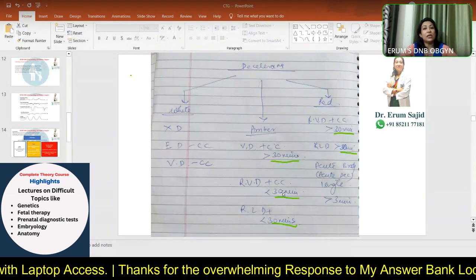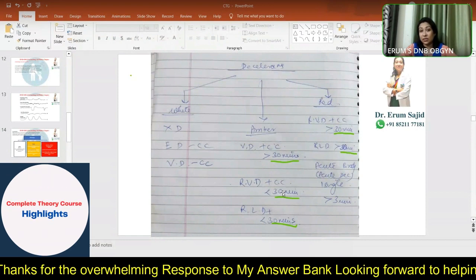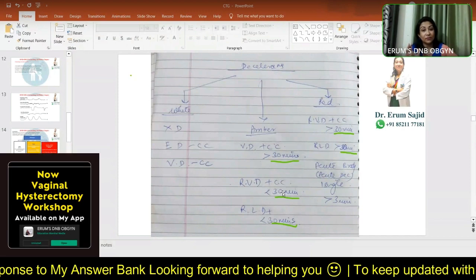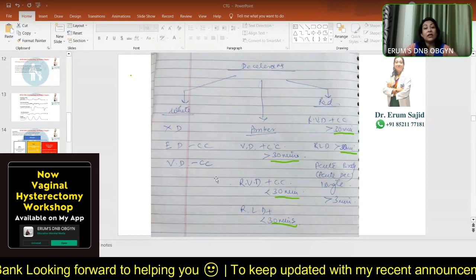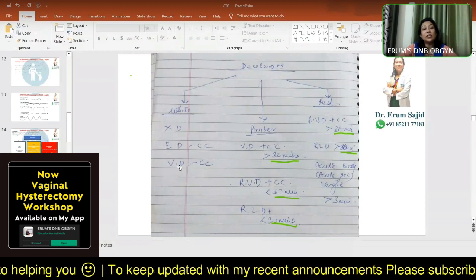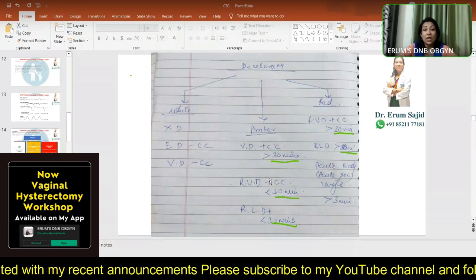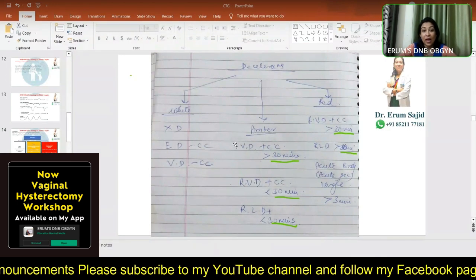Now you see that these variable decelerations are showing concerning characteristics, but you're still waiting for 30 minutes. Once it goes above 30 minutes, see over here, these were shown. So how long will you sit for here? These are variable decelerations which had no concerning characteristics. Now these are variable decelerations with concerning characteristics and are going above 30 minutes. So it goes into the amber category. Now you have started panicking, kind of.